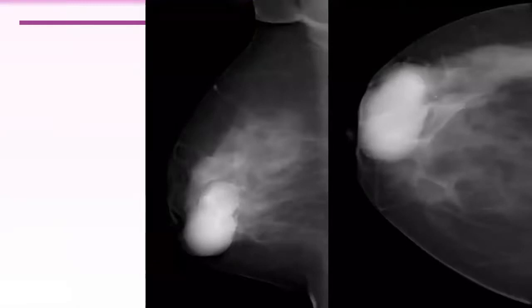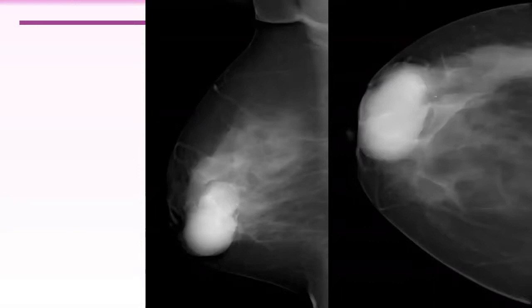This is 3 years back. The patient was then brought at that moment when we diagnosed, that image was not available. We reported it as BI-RADS 5, highly suggestive of malignancy by features, by characters. But it was just a papilloma or multiple papillomas. You see, benign papillomas behave, mimicking breast cancer.